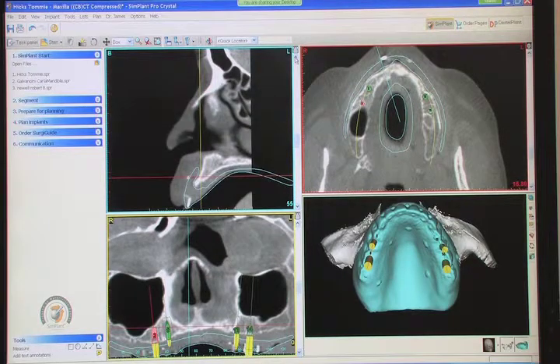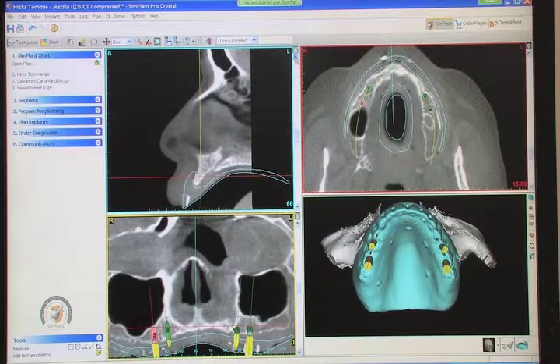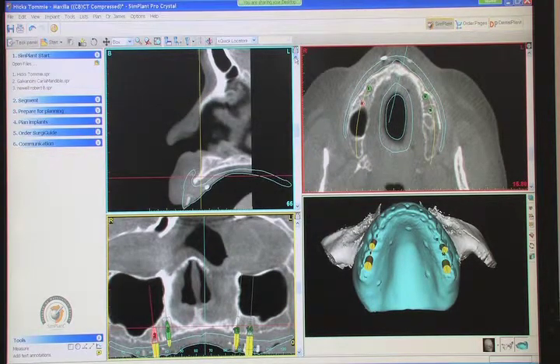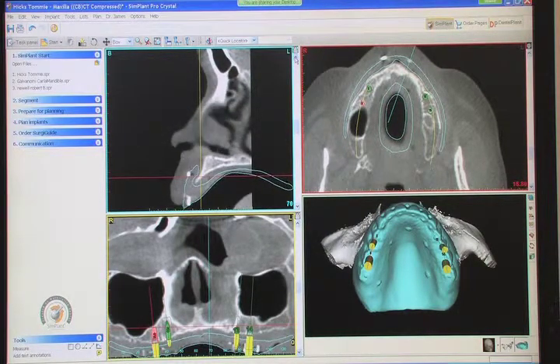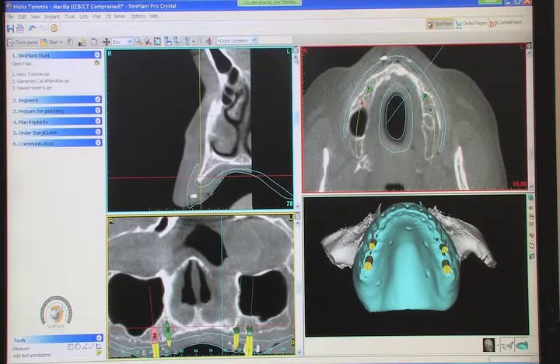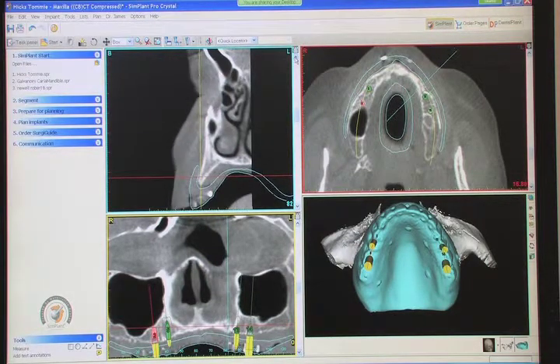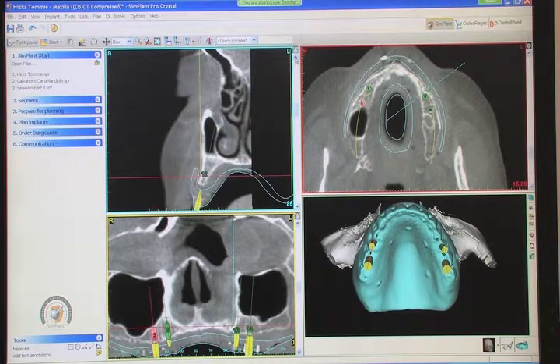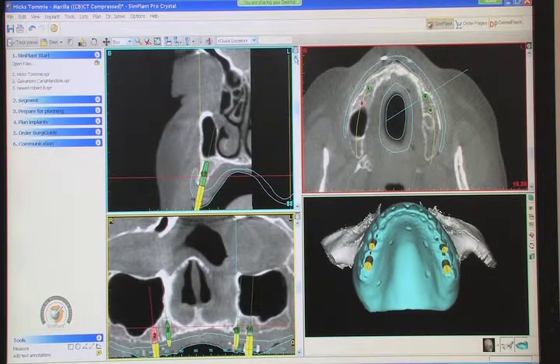This was the surprise to me after reviewing the panoramic, which we would normally do, looking at things in 2 dimensions. It looked like we had tons of bone to work with. And the ridge was a little deceiving also. By palpating the ridge, it appeared that we had good width of bone too. So the CT diagnosis in this case is just remarkable. It's unparalleled. I would have made a big mistake if I had gone with my original treatment plan.